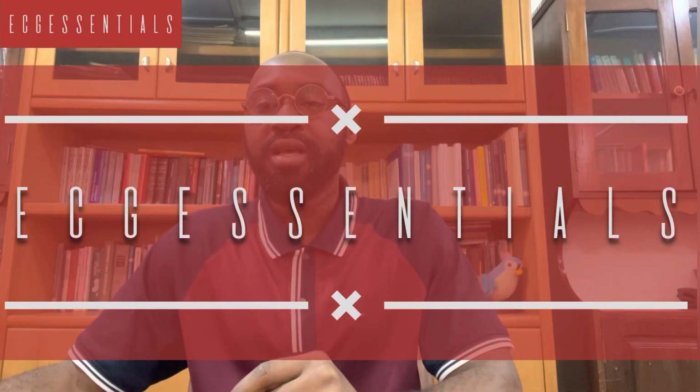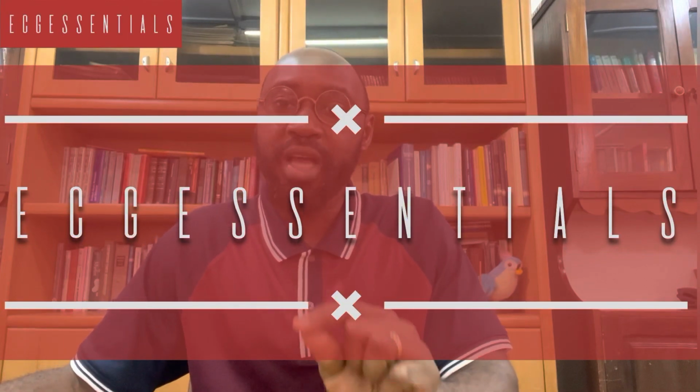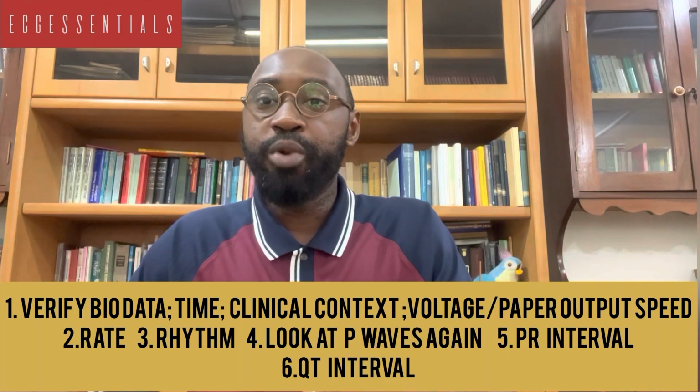All right. The other interval that we need to pay attention to will be the QT interval. We have said earlier that the QT interval represents the time all the way from ventricular depolarization to the end of ventricular repolarization.